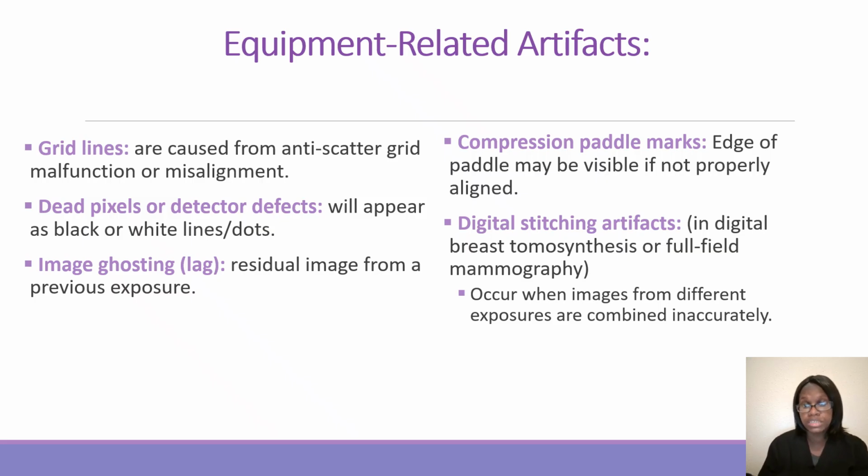Also, you have your compression paddle marks. This is the edge of the paddle that may be visible if not properly aligned. You also have digital stitching artifacts. In digital breast tomosynthesis or full field mammography, you'll notice this. It occurs whenever images from different exposures are combined inaccurately.